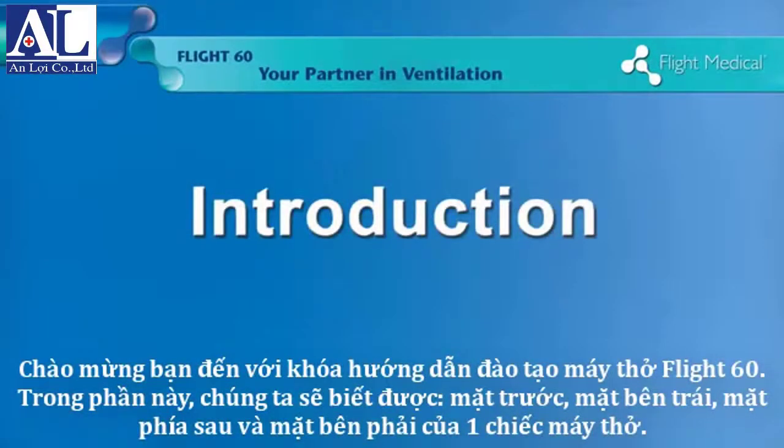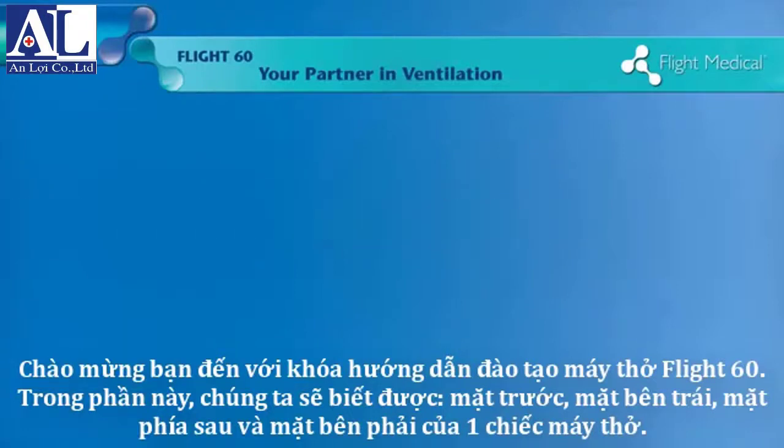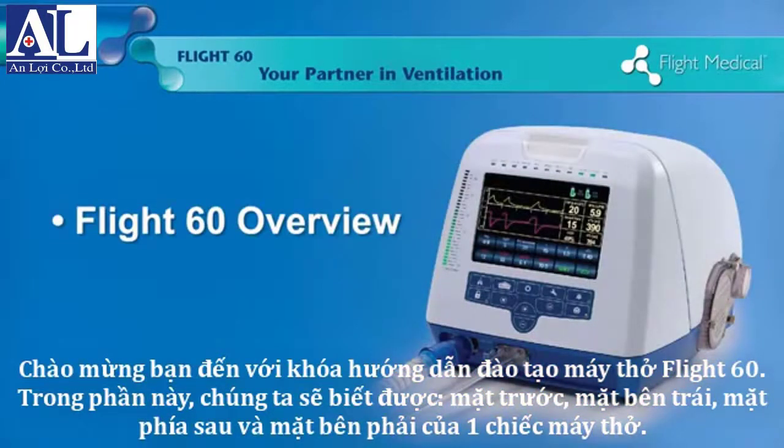Welcome to the Flight 60 Introduction Training Module. In this module, we will learn about the front panel, the left panel, the back panel, and the right panel.